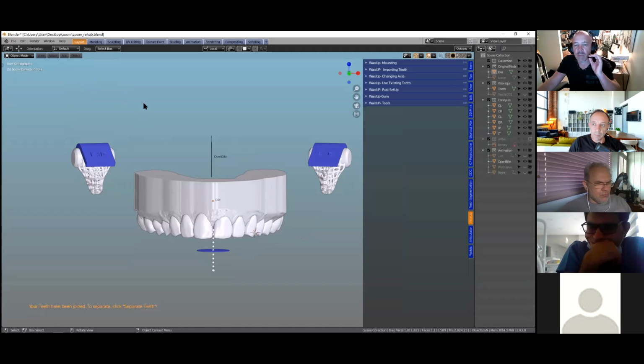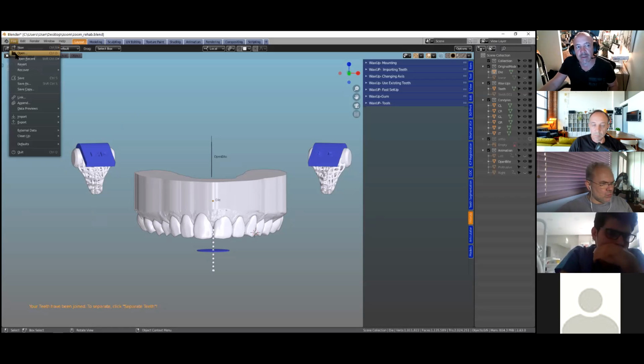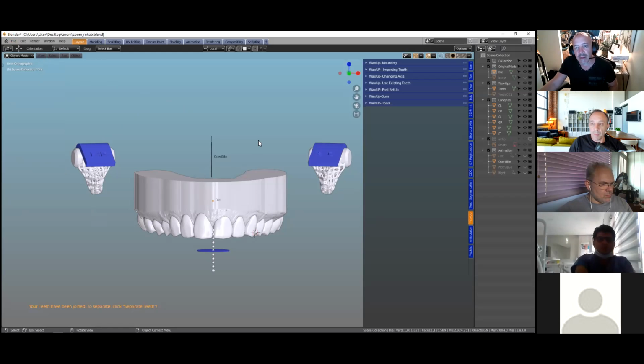In our crown and bridgework module, we'll then take that and fuse it to the die, because we need to block out the die. Often the dies are undercut. We need to block them out, and then we also need to join the body of the tooth to the actual margin. So that's in the crown and bridgework module. But for temporary crowns, you can just make a Boolean cut. And you can make them hollow and fill it later when you have the patient in the chair, right? Yeah. Okay, thanks.